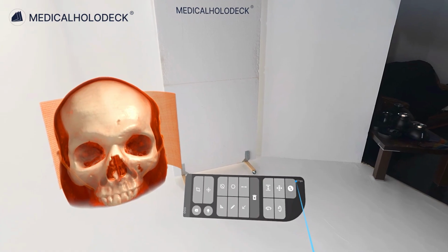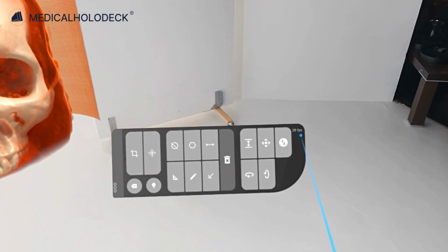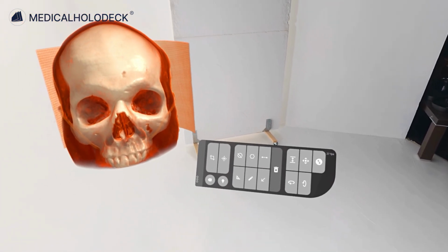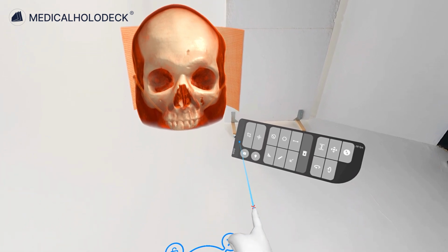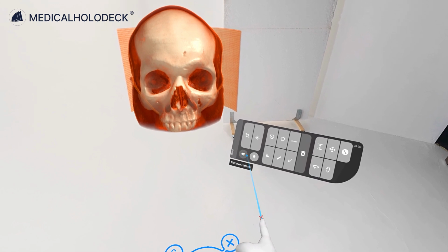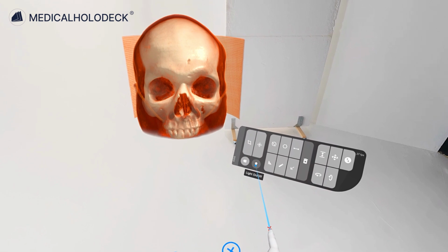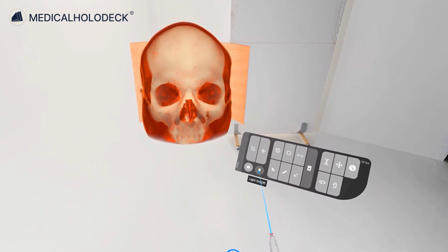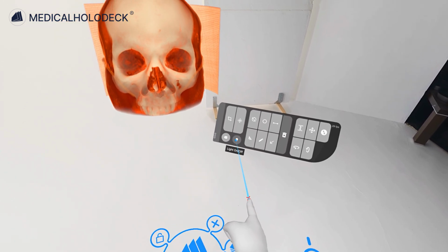The number in the top right corner of the pad shows the current frame rate, helping you monitor how smoothly the app is running. To remove a dataset from the workspace, press the Delete button. The lighting button toggles the lighting on your dataset. In Medical Imaging XR, this function is only available in the PC VR mode.